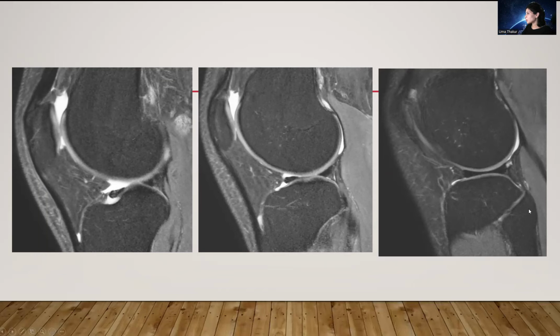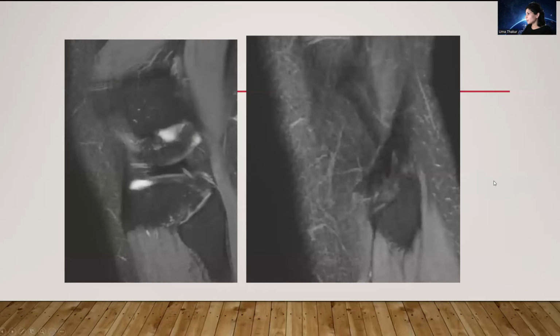Proximal tibiofibular joint is also well evaluated in this next cut when you're getting into the body of that lateral meniscus. On this cut, you see the peripheral body of the lateral meniscus, again, the proximal fibular cartilage. This is showing the biceps femoris tendon inserting, and this is the oblique orientation of the lateral collateral ligament that we were discussing earlier, which goes from anterior to posterior.